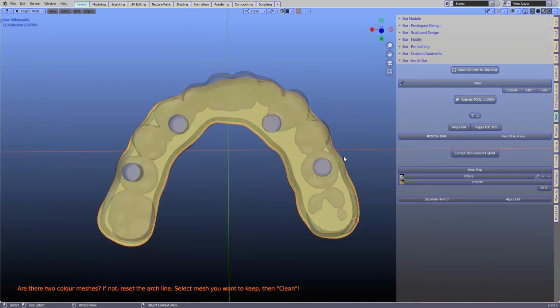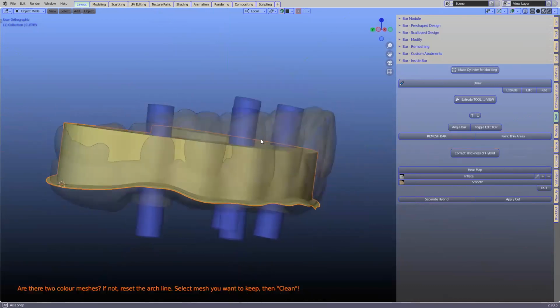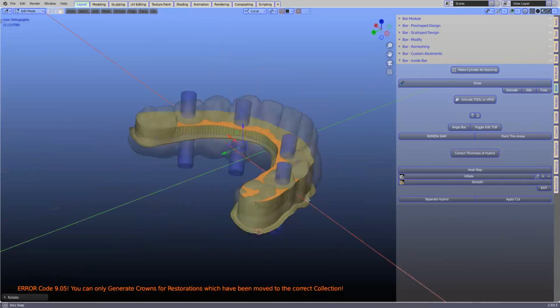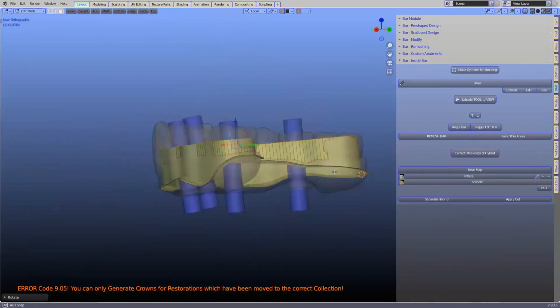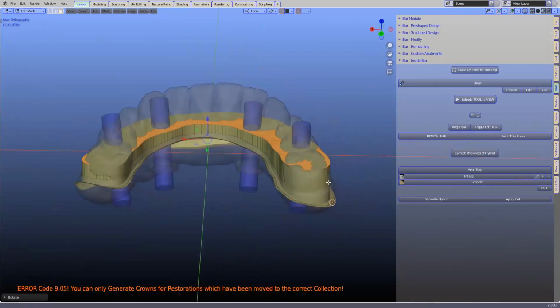Okay, so this is going to bring that up towards me parallel. So this is like the walls are 90 degrees. Again, I could change that a bit. So I'll toggle the top a little bit and use the R key just to rotate a little bit. But we can see how big this bar is. So we need to change this bar a little bit. And that's quite easily done. We have to make the top thinner.